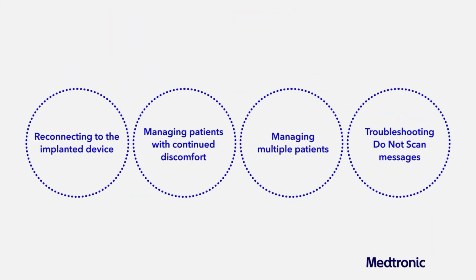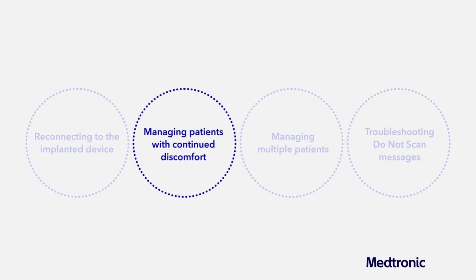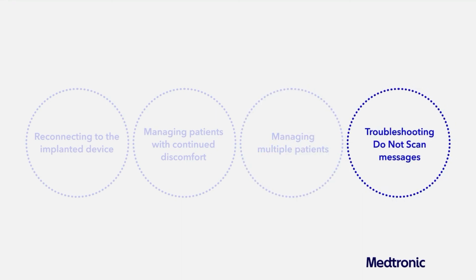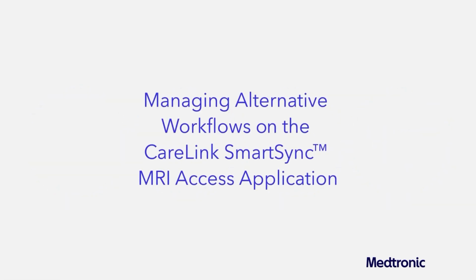This video covered 4 of the alternative workflows on the CareLink SmartSync MRI Access application: reconnecting to the implanted device, managing patients with continued discomfort, managing multiple patients, and troubleshooting Do Not Scan messages. For additional information, please see the MRI Access Application User Guide available on Medtronic Academy. This concludes the video on managing alternative workflows on the CareLink SmartSync MRI Access application.